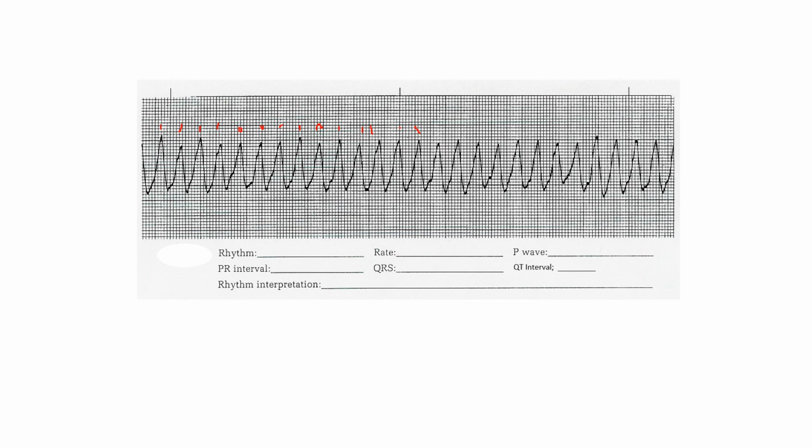Hit the button because you have your pads on, and hold the button down until it delivers, because again, it's not like defib where you hit the button and it delivers. You have to hold the button down. It might take an extra half a second to identify where the R wave is, so that it delivers in a safe place, so it doesn't hit the R on T and cause the patient to go into V-fib.